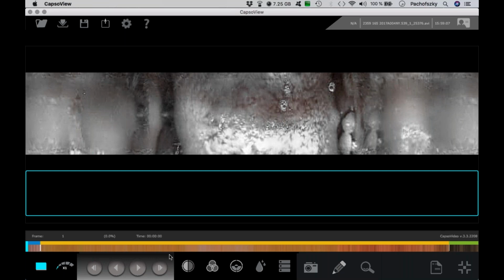And if you look at this, often you can see there's a skipping in the color, and in this area we can suspect that there maybe will be the change from stomach to the small bowel or from the small bowel to the colon.